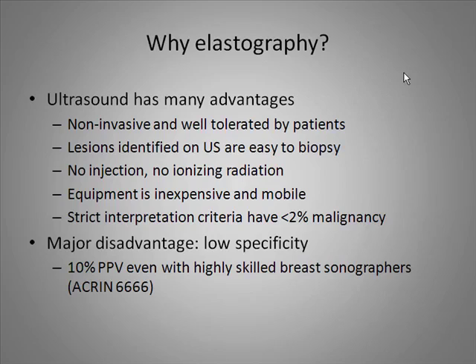So why elastography? Primarily because ultrasound as an imaging test has many advantages. It's non-invasive, well tolerated by patients. When we see a lesion on ultrasound, it's very simple and easy to biopsy it. We don't use injections or ionizing radiation. The equipment itself is relatively inexpensive and mobile. And if we use strict interpretation criteria for our assessment of benign masses, we will miss fewer than 2% of malignancies.